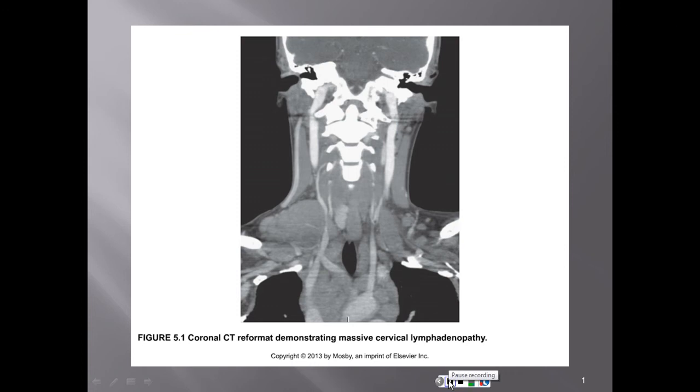Both multi-slice helical CT and MR can provide exquisite imaging of the normal and pathologic anatomy of the head and neck. Although each modality has advantages and disadvantages, the decision on whether to use CT versus MRI for each individual case is often based on considering which techniques the patients are more likely to tolerate.